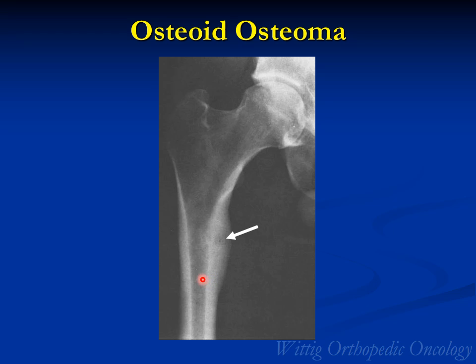It's another osteoid osteoma of the cortex. It's arisen in the cortex. It's very irritating. It's caused a buttressing type of periosteal reaction or a continuous periosteal reaction where the cortex looks thickened. It may be difficult to see this nidus in this location, and you may need advanced imaging such as a CAT scan or an MRI.